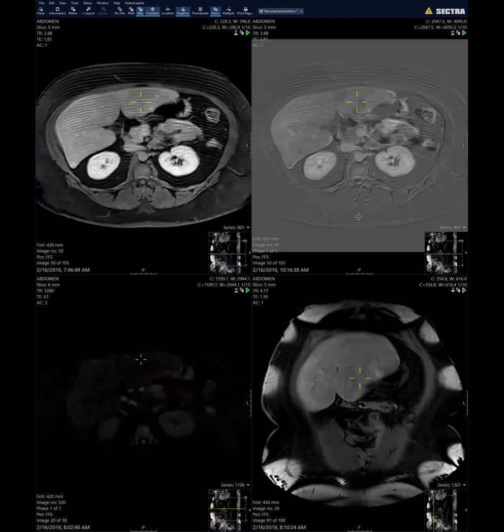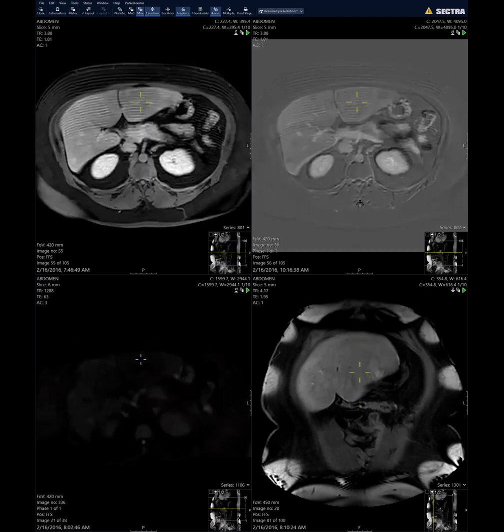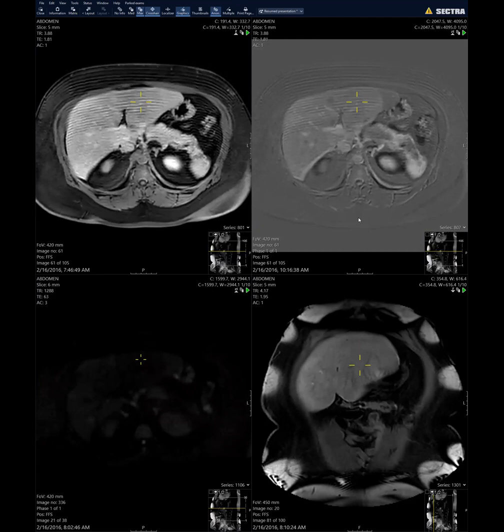Yes. We just had a case very similar to this, almost identical. This was a woman with multiple adenomas, and most of them look exactly like that, including kind of iso-enhancement on the hepatobiliary phase, except for one. One was clearly hypo-enhancing. So I would not necessarily discount rare adenomas from the differential. So Victoria, that's a good point. Recently, some papers have been saying that there are probably more inflammatory adenomas that retain EOVist than we realize.